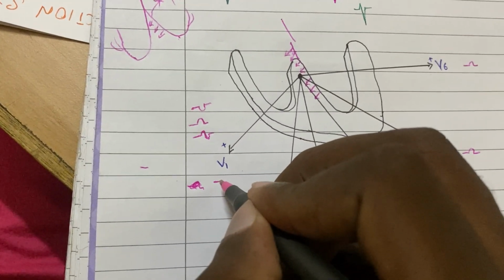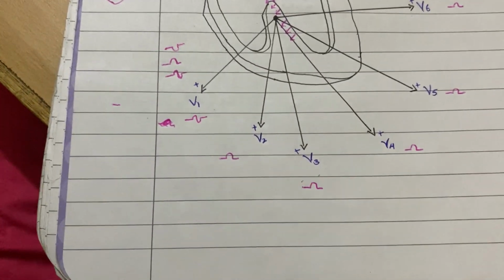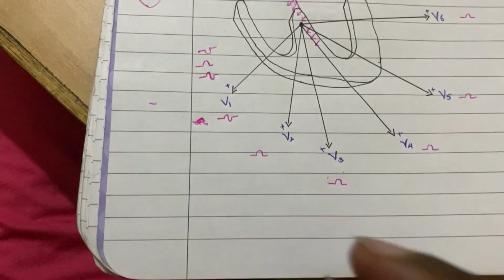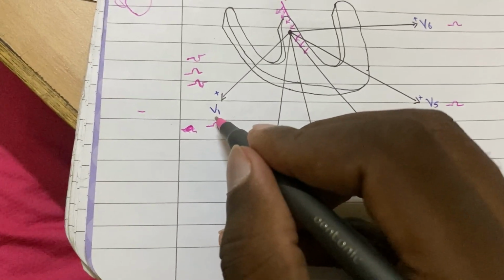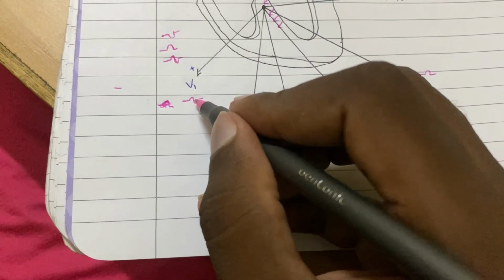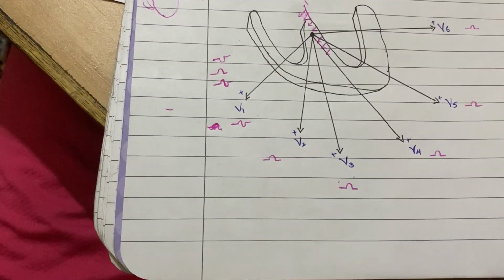Let me take when it's biphasic. If it is biphasic, it has a limit. The first part should not be more than 1.5 in amplitude, and the negative part should not be more than 1 deep. The other is in height.